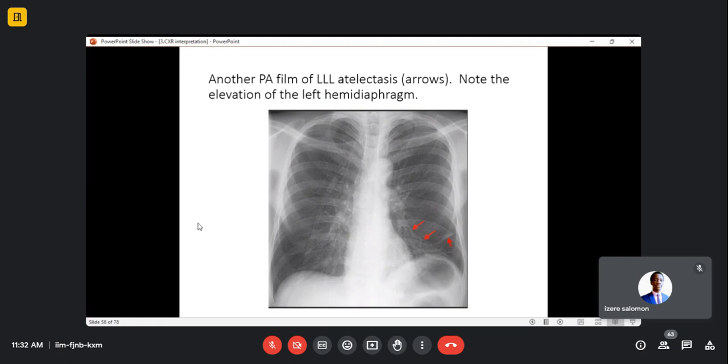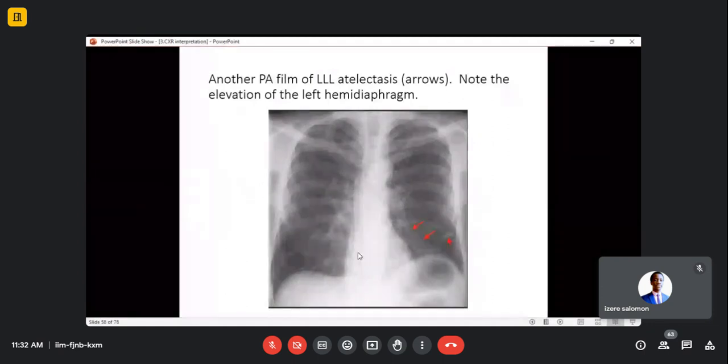Okay? So sometimes it is not as clear as you are expecting it to be. Like in this image, don't read there. Just check the image. I can see a very good chest radiograph. Technically, it's good. Everything's fine from the technical side. Those 5 things are okay. But what I see immediately, something that comes out without these arrows, is the left hemidiaphragm that has gone up. And immediately I know this is not normal. Either something is pushing or something is pulling up.